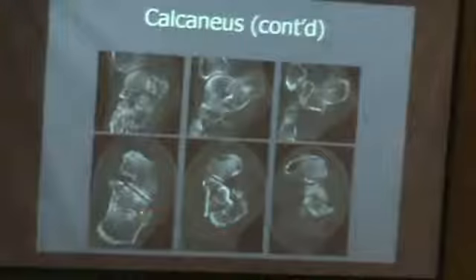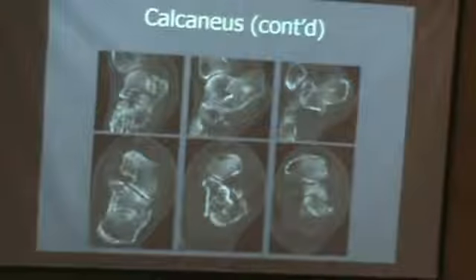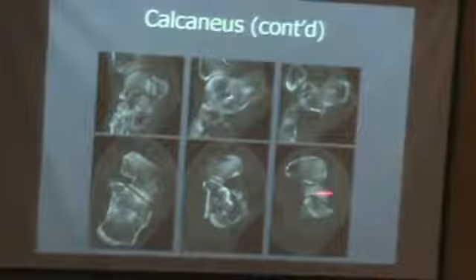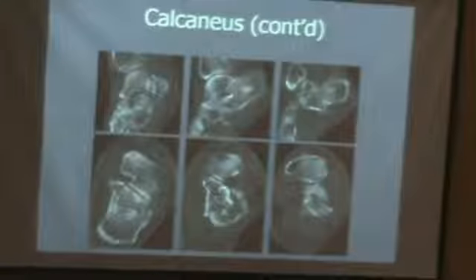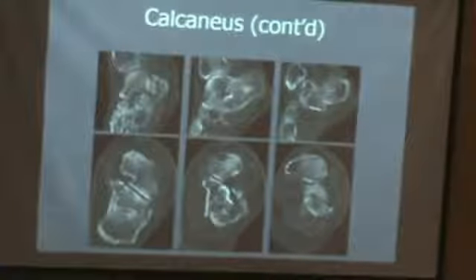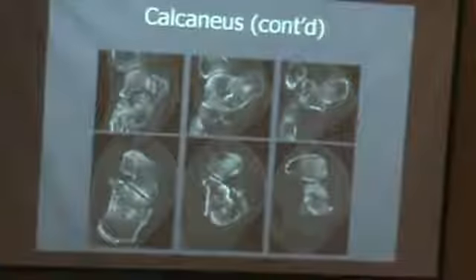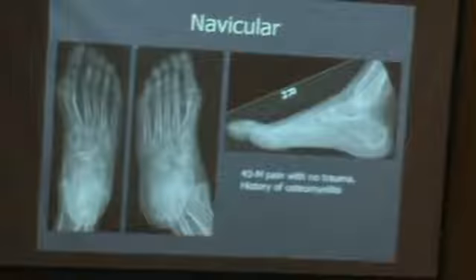It's all over the place, extra-articular, intra-articular, with a lot of displacement, a comminuted fracture, and we don't see anything on the X-ray. Again, my message here: if you have high suspicion and you don't see anything on the X-ray, go to the next CT or MRI, and better if you go to the MRI.